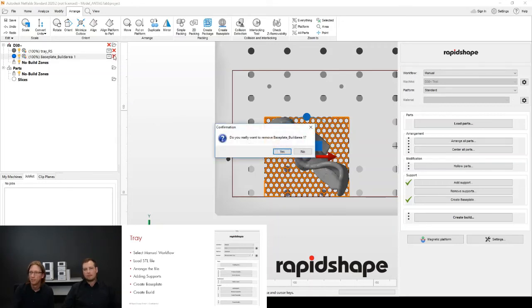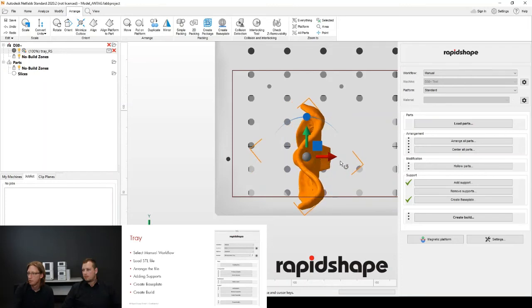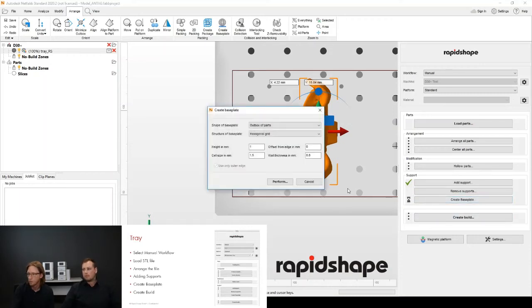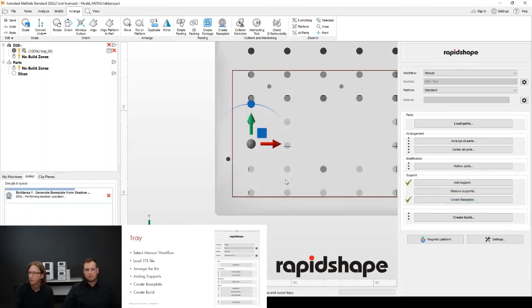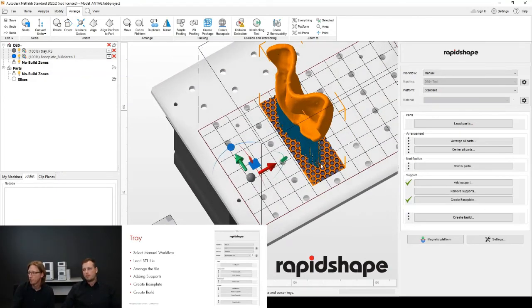So now let's get rid of the base plate once more, and I just rotate my tray to have a minimal outbox, and I just perform the same step again, and you will see that we won't use so much of the precious resin. That's correct. And this is much better now. Yeah. So that's what we want to have. And you can line them up really nicely together.